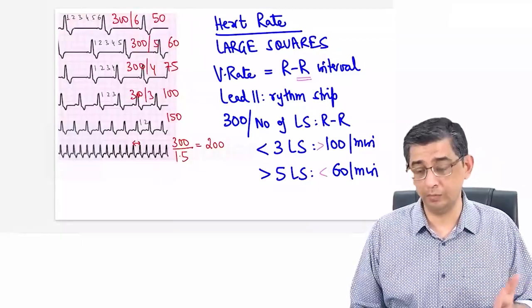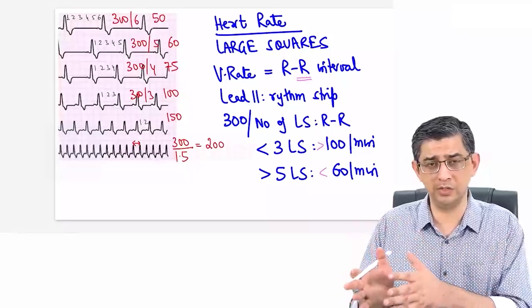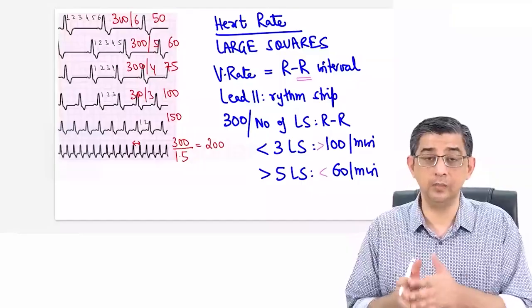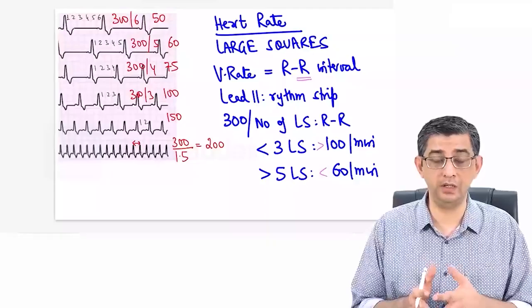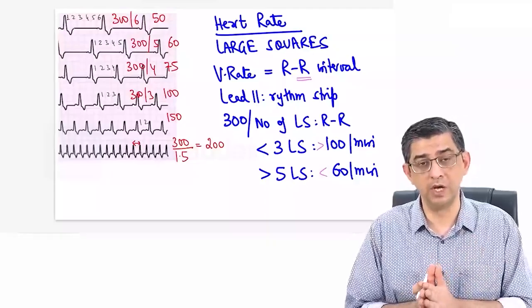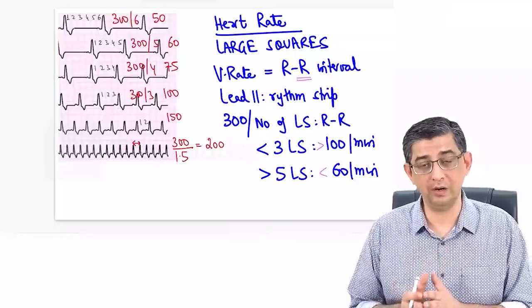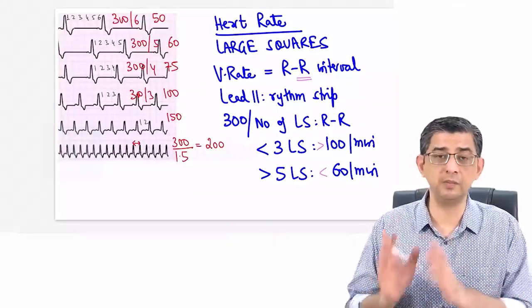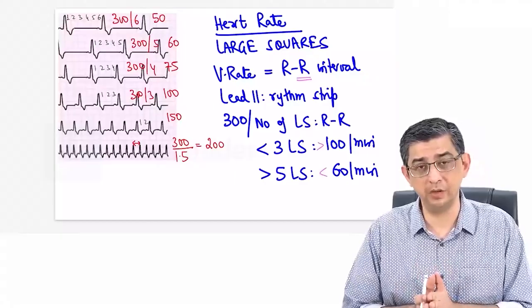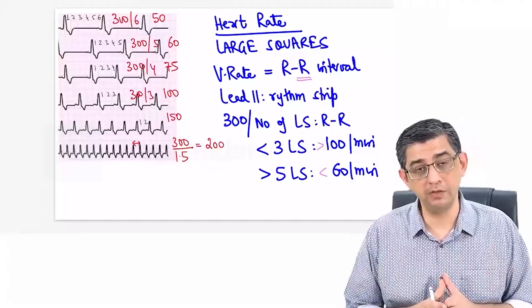So lots of times, just by counting and evaluating, you narrow down to 2 differential diagnoses, and then subsequently you will come to realize that in atrial fibrillation there are no P waves. In multifocal atrial tachycardia there are variable morphologies of P waves. So if I get an ECG in the exam in which there is an irregular heart rate, if P wave is absent, it is atrial fibrillation. If P wave is present, I'll straightforwardly answer it as multifocal atrial tachycardia. I'll not even try to look at the variable amplitude of the P waves per se.